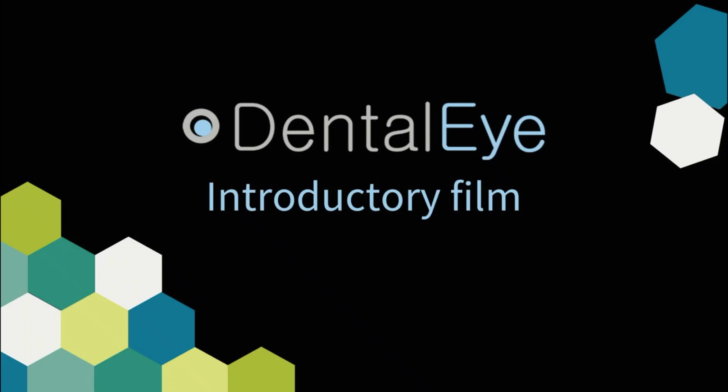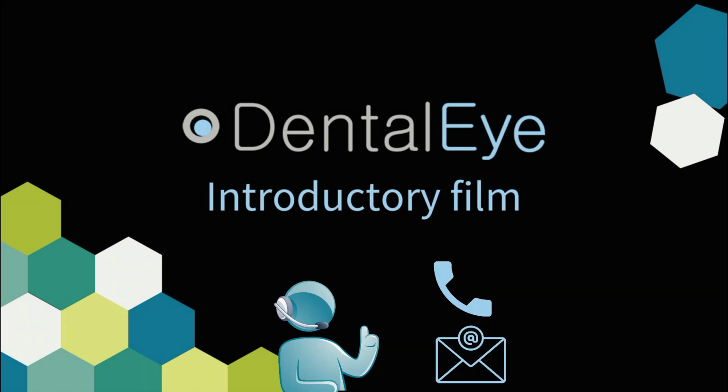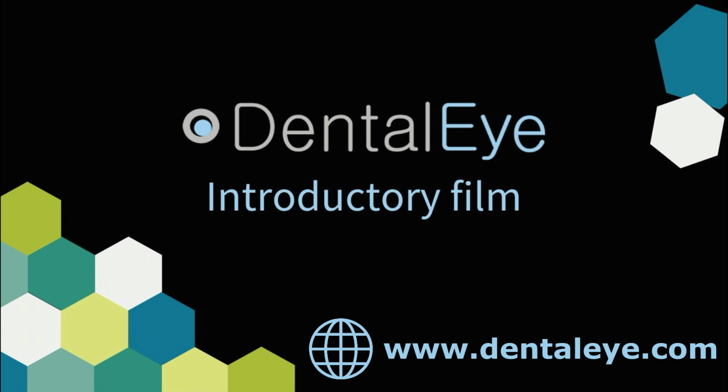We have now gone through the basics on how to work with DentalEye imaging system. Of course, there is a lot more that can be done and a lot of other features to learn. Please contact your DentalEye distributor or visit our website www.dentaleye.com for more information and support options.